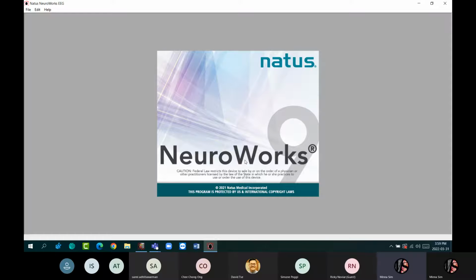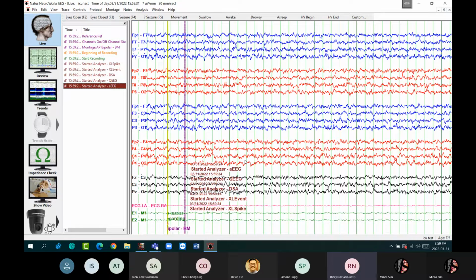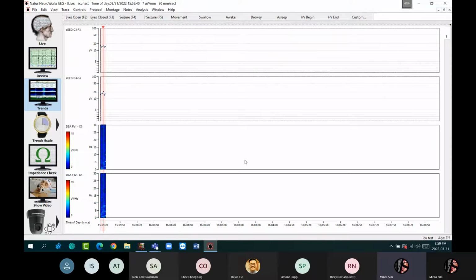And I can start the EEG. So it will automatically show the icons on the side. Now I can use this surface on a normal monitor or a touchscreen monitor. If you have the touchscreen monitor, the users can use the touchscreen to activate and change the panels accordingly.